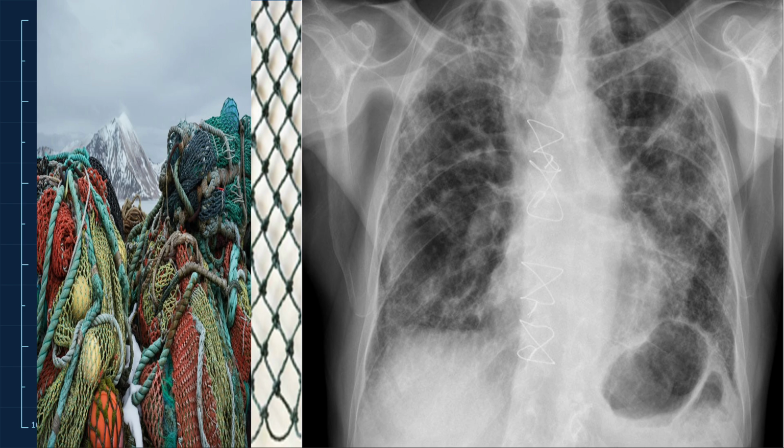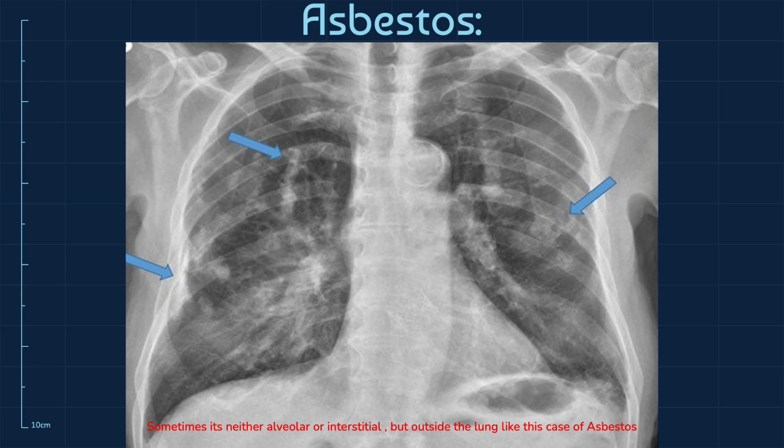And this is just an example for you to recognize that on both sides of the lungs, there's diffused reticular interstitial fishnetting sort of pathology. And sometimes you may look at a radiograph and you can't really determine what sort of pathology. Is it alveolar? Is it a consolidation? Is it interstitial? It sort of has a haphazard appearance to it. And that is commonly seen in asbestos.